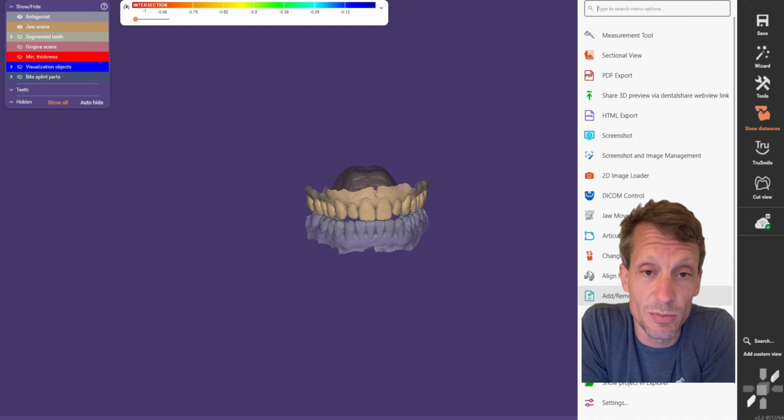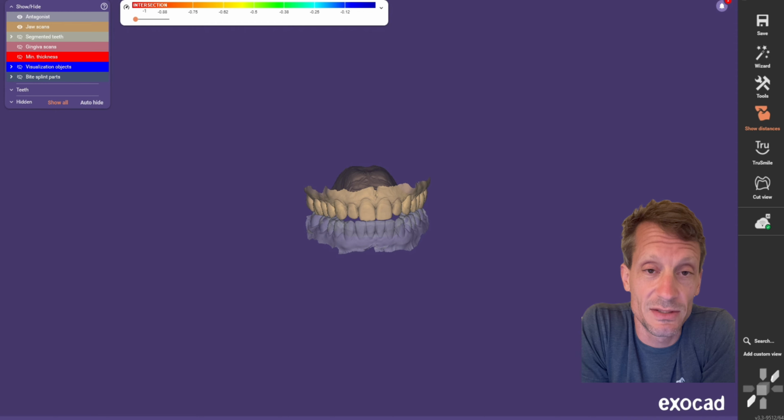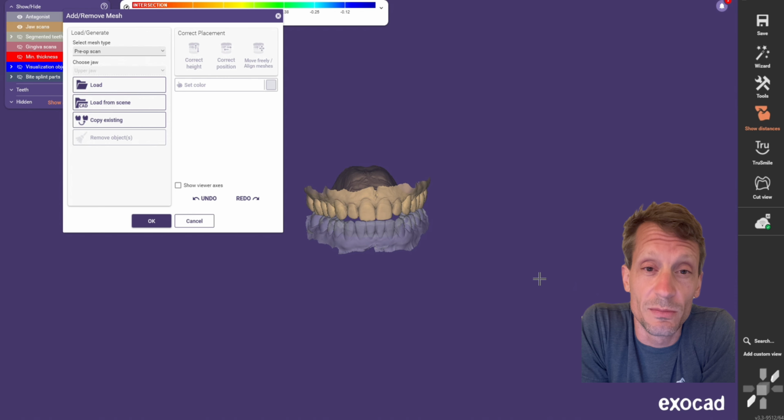Clone 3D Dental Pro is just insane. It's only $150, and when you're doing reconstructions, getting that upper jaw positioned relative to the hinge axis is really important, especially when you're going to be redesigning cusps and fossas and trying not to have teeth collide into one another.